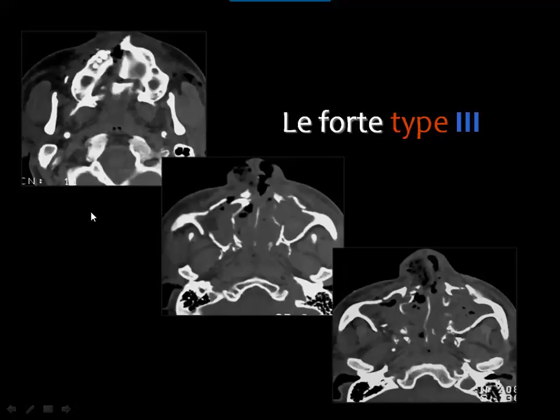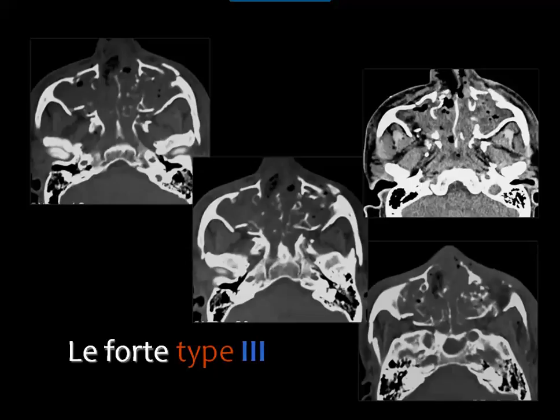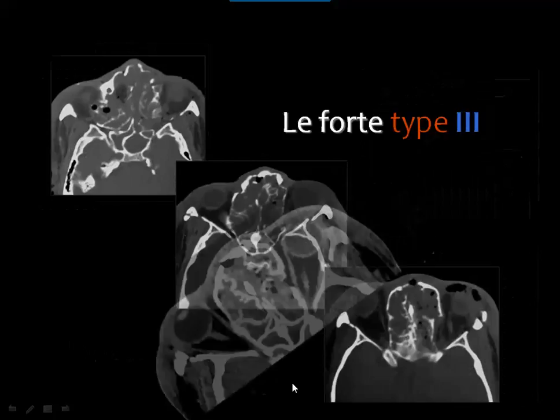And here, comminution of the alveolar margin and the hard palate, comminution of the medial parts of the maxillary sinuses, the bony nasal septum, separation of the zygoma bilaterally, and comminution of the medial wall, comminution of the pterygoid blades, and comminution of the ethmoidal air cells, and you see also fractures of the zygomatic arches. You can see here the soft tissue window images will show hemorrhage, extensive hemorrhage in the sinuses and in the nasal fossa as well.